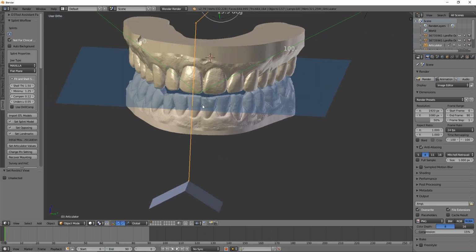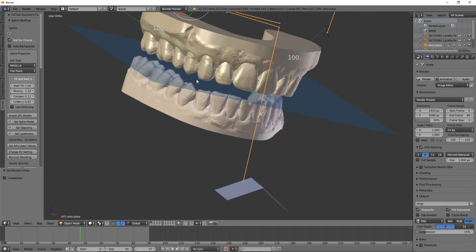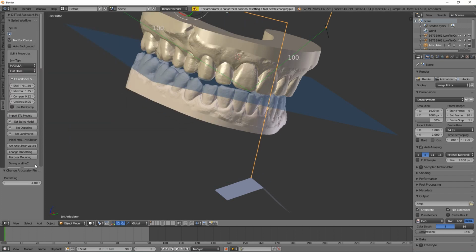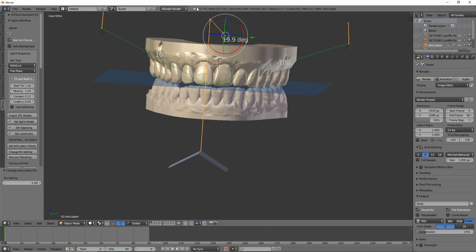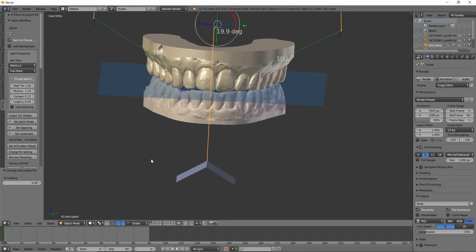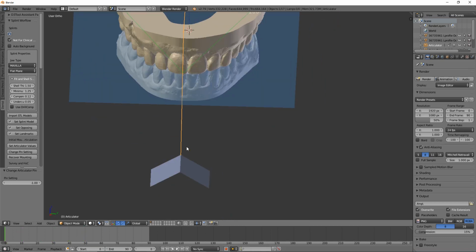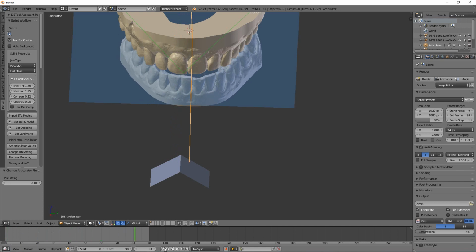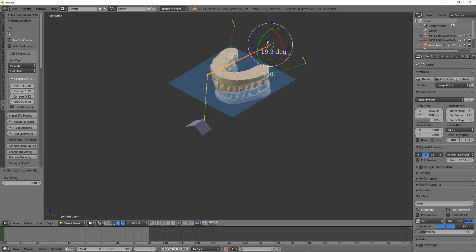But then you run into trouble with things like if the user was in an excursion and said, oh, I don't have enough clearance, and they changed the pin setting. Sometimes it wouldn't bring it all the way back to 0, because one iteration of the loop wasn't happening. So if they did this and then they rewound, depending on which way the articulator was, it might not have each condyle look back at each other.